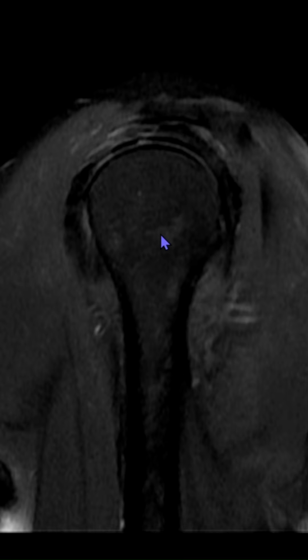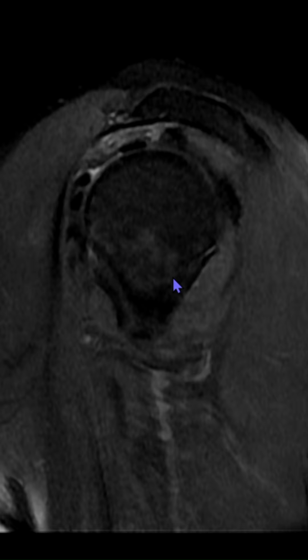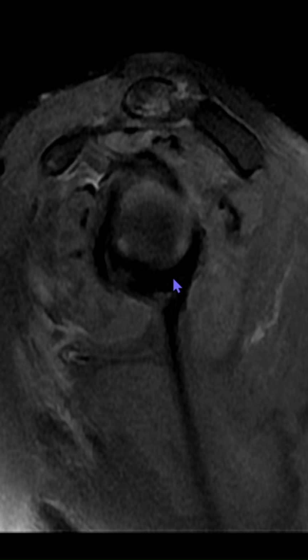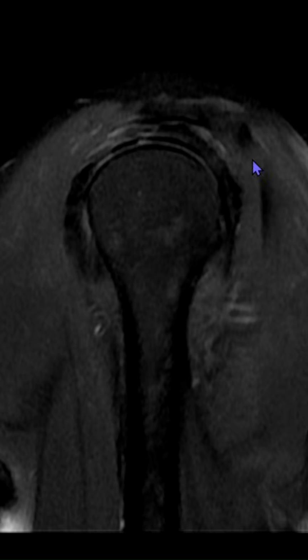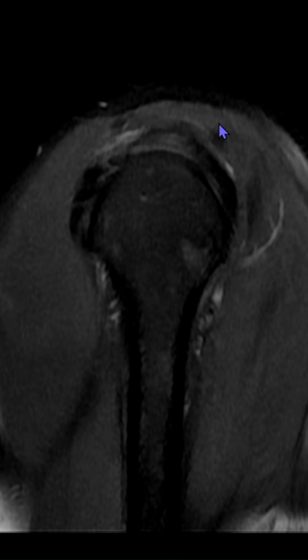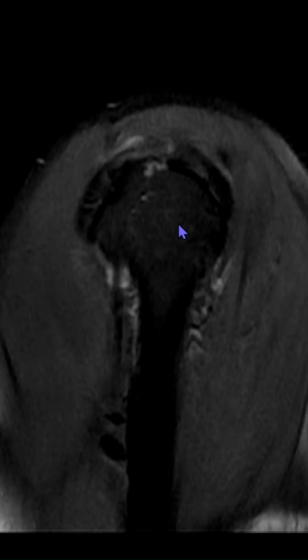This is a scan of a 60-year-old gentleman who came with complaints of pain in his shoulder since last 2 weeks. So, at the age of 60 years and complaints of pain, the first thing that we'll think of would be rotator cuff tear. But here we are seeing that on the sagittal PDFS images, the rotator cuff appears almost good. So there is no significant tear to cause such complaints.